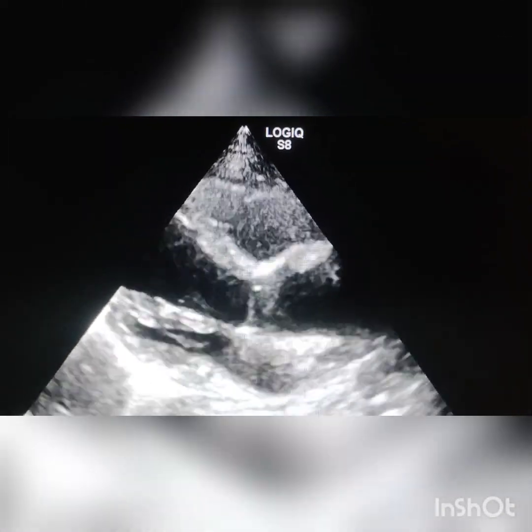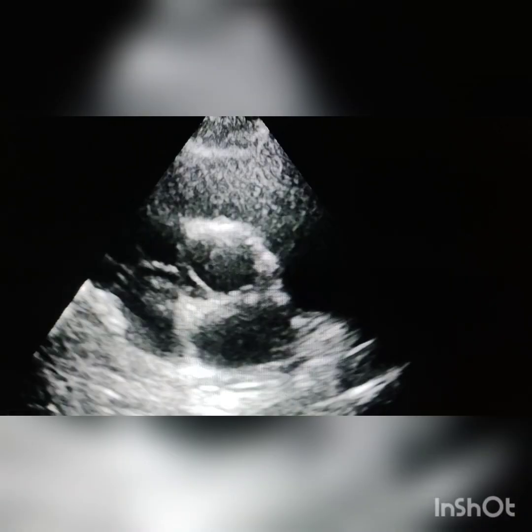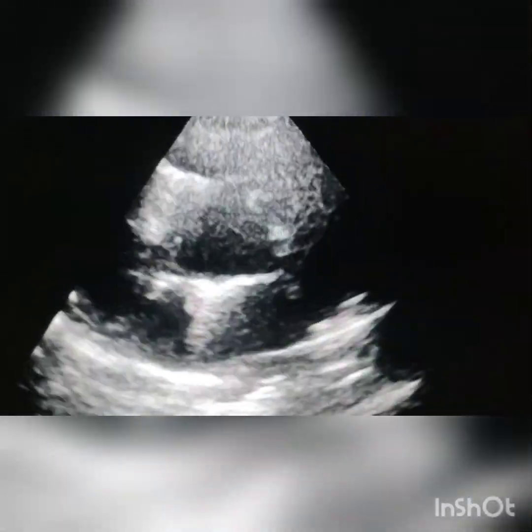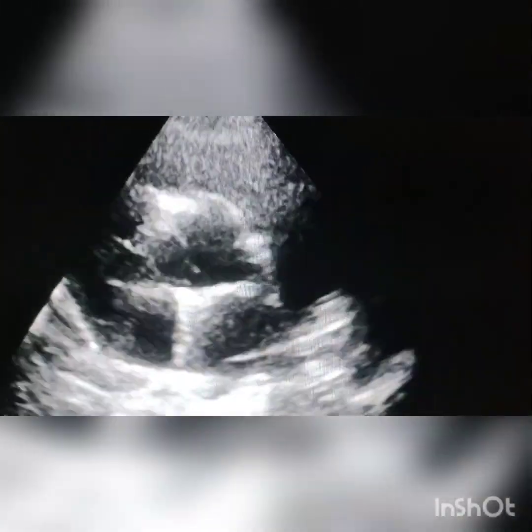for aortic dissection. On echocardiography, the right parasternal view may be employed to better visualize the ascending aorta, and the suprasternal view must also be obtained to look for coarctation of aorta, which is seen in about 10% of patients of bicuspid aortic valve. Regular follow-up, including echocardiography, is warranted for evaluation of progression of aortic valve disease and for monitoring the expansion of the aorta.